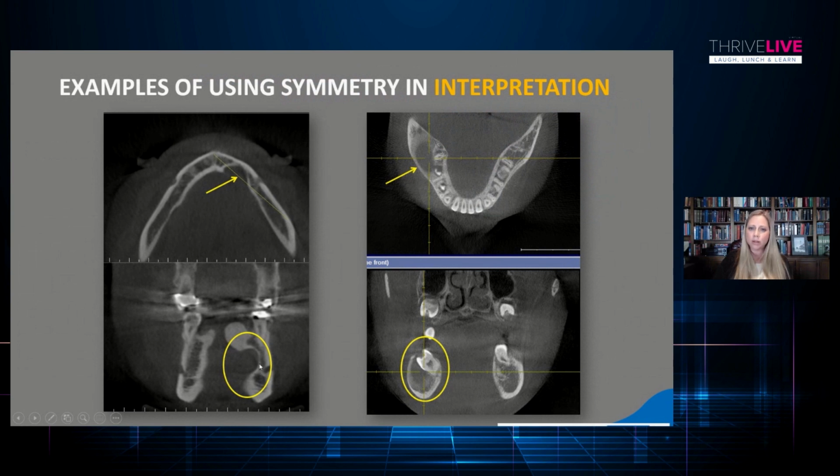We've got some remodeling of cortical borders. We do have a large lingual tori, but it looks like we have a little bit more than that. And so that's our anterior Stafne bone defect. But again, even if you didn't know that, you would realize something is different, and I want to refer this out to a radiologist to be looked at for further evaluation.